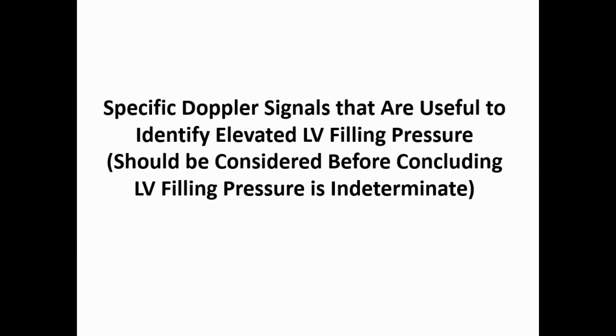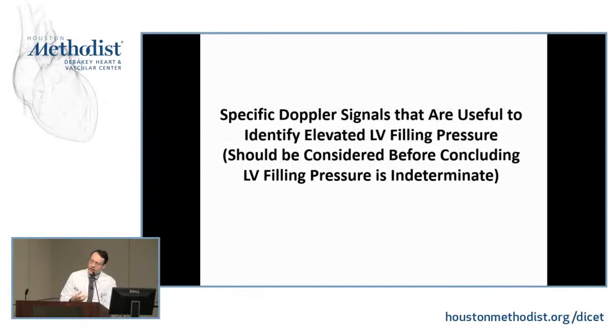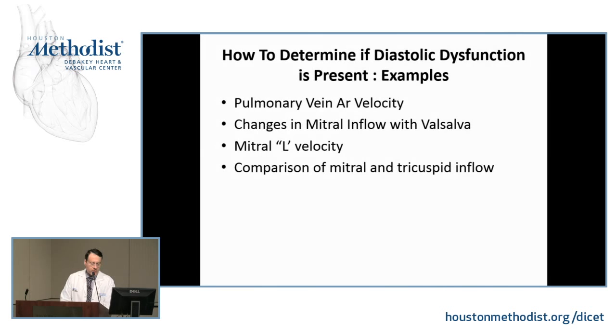Next, as we are going through the study, we need to look for specific signals that tell us that LV filling pressures are elevated. It is important to look for these signals and think about what they say before you come and conclude LV filling pressure cannot be determined. Okay, what are these signals?